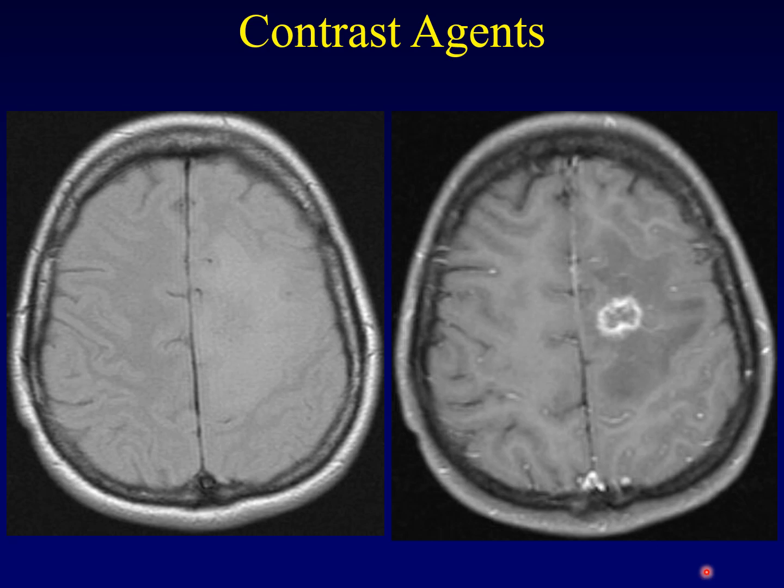It is a classic conundrum in radiology to distinguish between a tumor and radiation damage, because they look so much alike on post-contrast imaging. Let's see if you can think back to earlier in the lecture and figure out if there's another modality that might help us in this situation, where if we weren't sure whether this was a tumor or if this was radiation necrosis, what other modality might we employ?